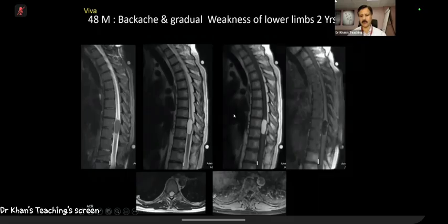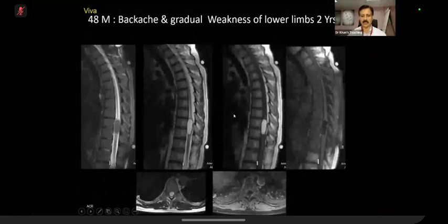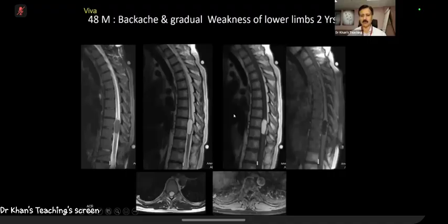This case is from the American College of Radiology, and the irony is that they operated on it, and this is a biopsy proven lipoma. So radiologically speaking, when you see fat, look at other signal. A lipoma will suppress completely, but a dermoid, histology-wise, has got various components. There will be something other than fat inside a dermoid. So that is how you discriminate radiologically speaking, right? So this is complete fat, and so this is a lipoma.